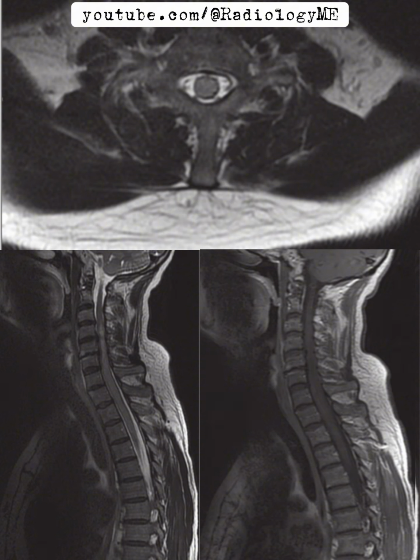Now, what's notable here is that there's no cerebrospinal fluid visible anteriorly or posteriorly around the spinal cord at these levels, which hints at how tightly packed the cord is within the vertebral canal. I'm also seeing some posterior disc and osteophyte bulges in the mid-cervical spine, although they don't seem to be causing compression at the affected levels. So the disc changes are a secondary finding, not directly related to the primary pathology we're dealing with here.